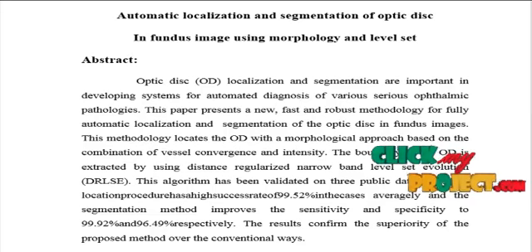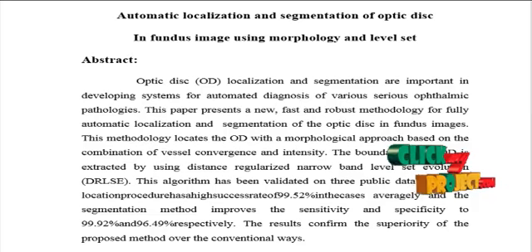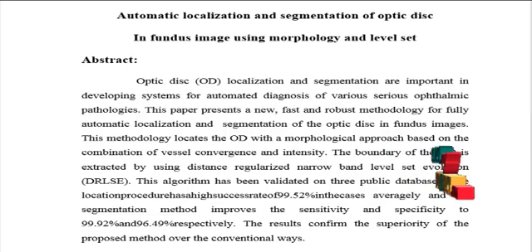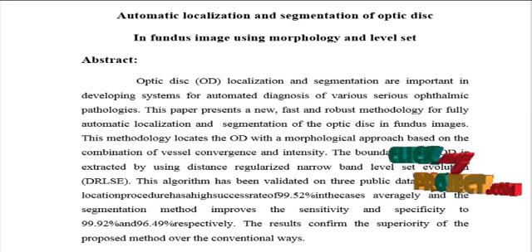From the detected regions, the brighter intensity is obtained based on the identification of the pixel having maximum intensity, and we subtract some 10 to 20 pixels from the images, and the pixels between the particular ranges were extracted as the maximum luminous pixels, and the regions were used for the detection of the maximum size.